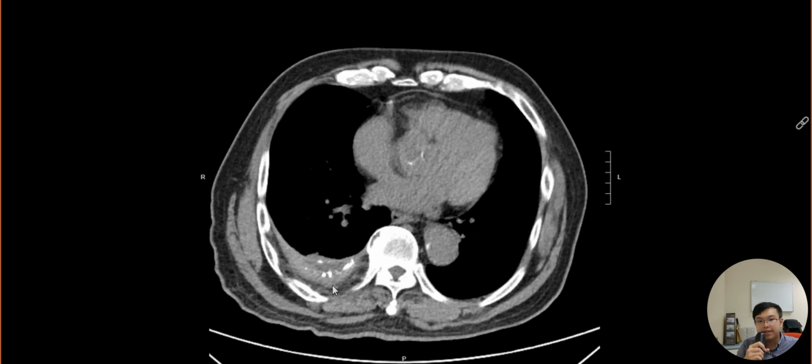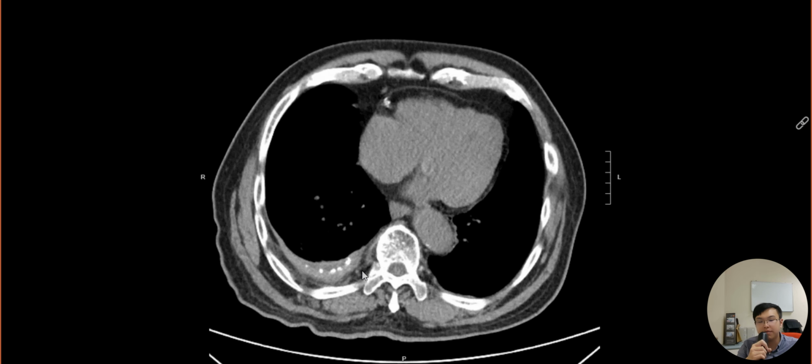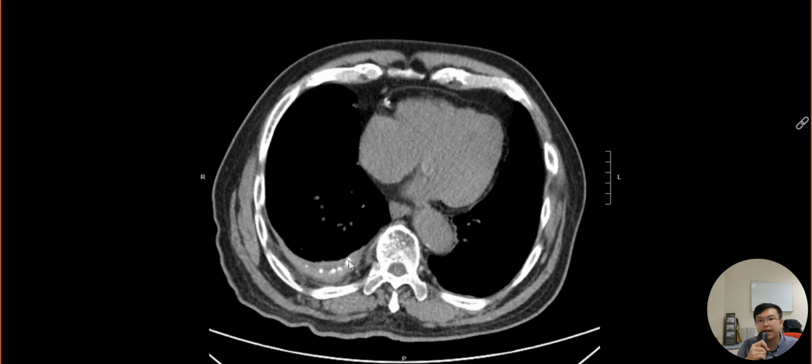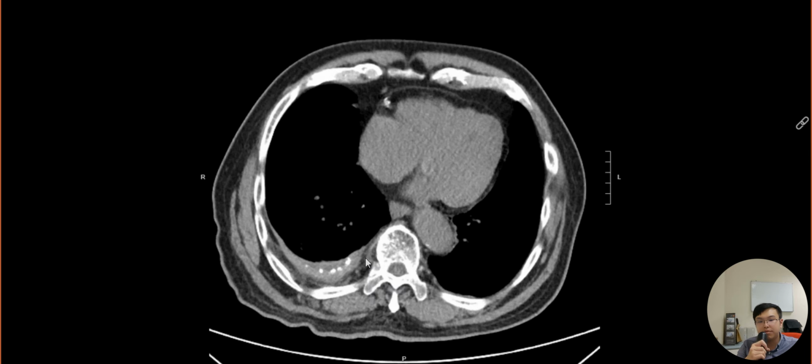Actually, we appreciate some smooth thickening involving the pleura as well as some calcification, but just a small amount of effusion. So it's a kind of chronic pleural disease, usually with prior causes such as granulomatous infection or hemothorax, something benign. We can also appreciate that the adjacent extrapleural fat plane is quite preserved.